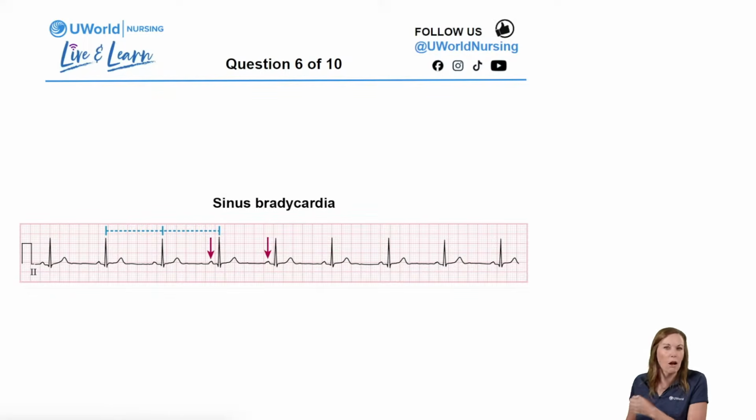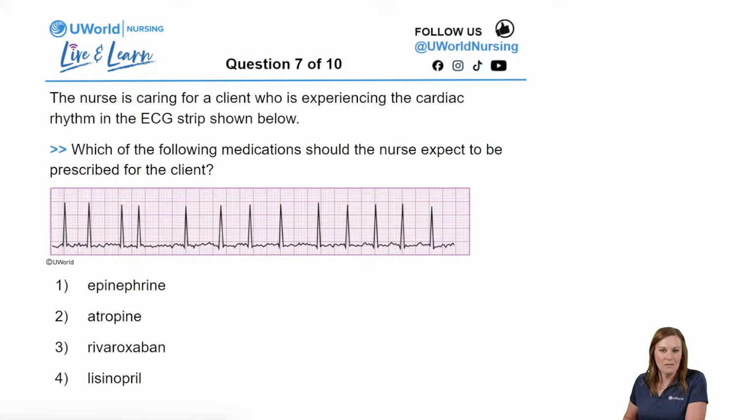So we think about problems with our SA node, problems generating our electrical activity in our heart. So good job, you guys. Okay, let's see what we got.